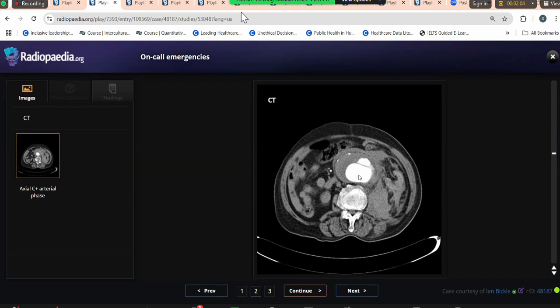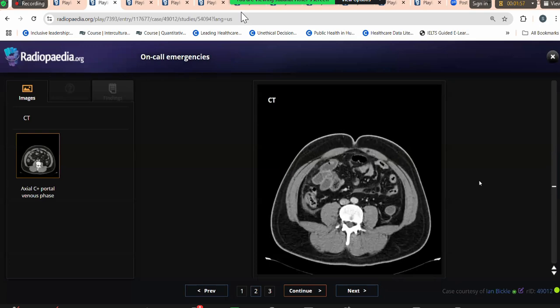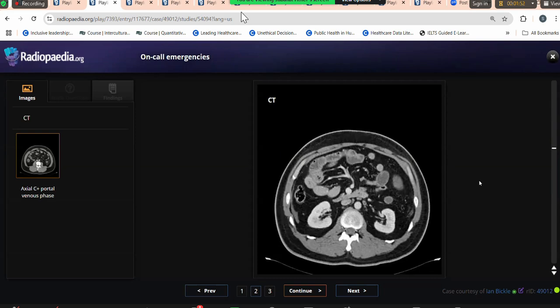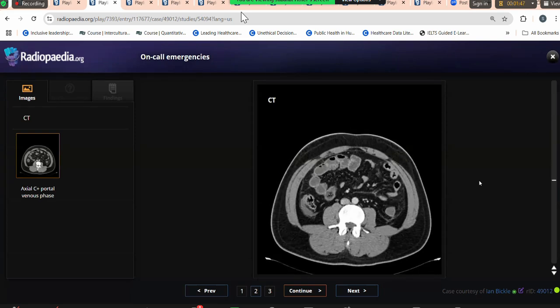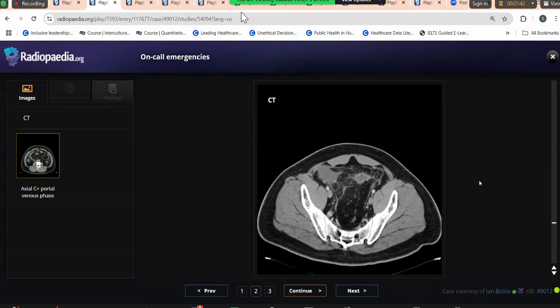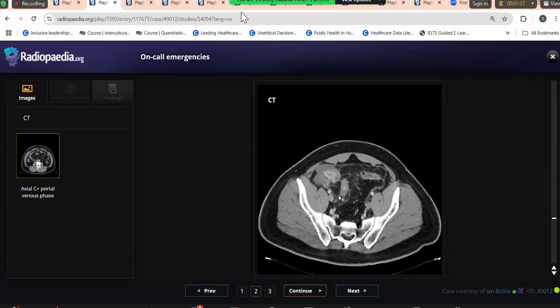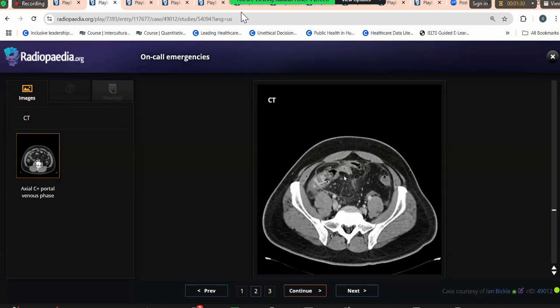Let's go to the next case. Yeah. So this was basically to show the day-to-day scenario that the surgical team and the consultant will call you, or they come up with your clinical team and say, oh, for us, the patient is not acute appendicitis. So as a radiologist, you should be confident when there is acute appendicitis. And as the candidate was telling, is there any doubt that this is a blind ending loop? Is there any doubt that this is a blind ending appendix, thickened, an appendicolith, with all the inflammatory changes in the right iliac fossa and the midline pelvis?